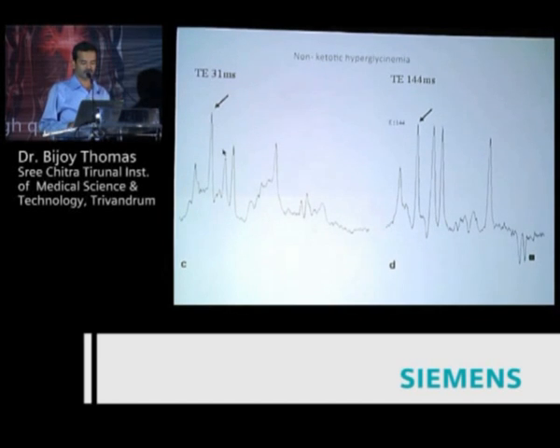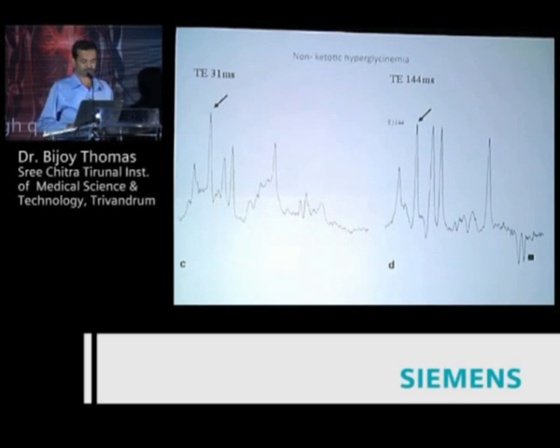So how do you differentiate between myoinositol and glycine? Glycine and myoinositol resonate almost at the level of 3.56 or 3.6 ppm. In a 1.5 Tesla MR image, you are not going to differentiate between glycine and myoinositol if you do only one sequence. So this is how you do that. Myoinositol has a shorter T2 relaxation time than glycine.